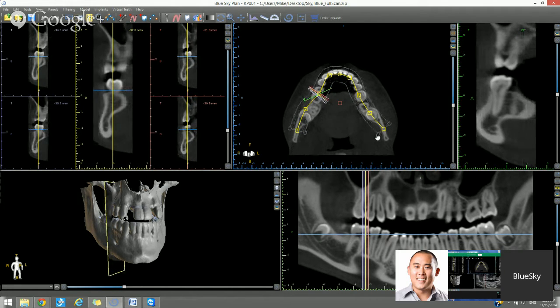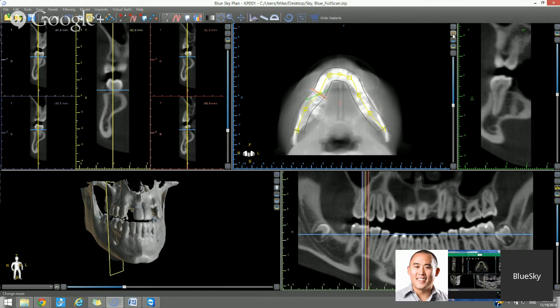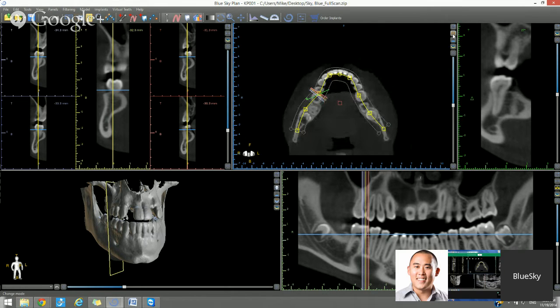If we widen our range of view in the axial, then we can see how it affects the tangential view and the cross-section view by controlling the width of the slice. Jumping to our axial view, we said it is stacked like a deck of cards. It's horizontal slices. We have the ability to enlarge it. We have different viewing modes that you're able to choose from within the axial view. You could control which indicators are visible in the view.